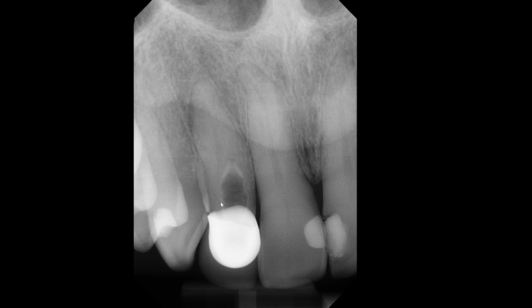The second one that I would consider, although not as strongly, is internal resorption. Just because there's a radiolucency relatively in the center of a root, you could consider internal resorption, but there are things that I do not favor that as much.